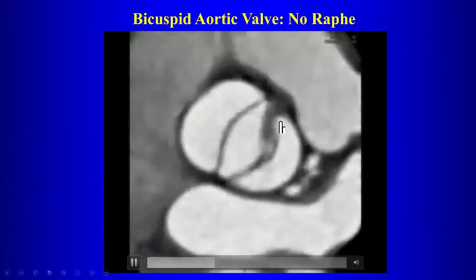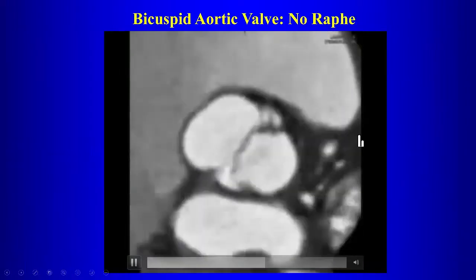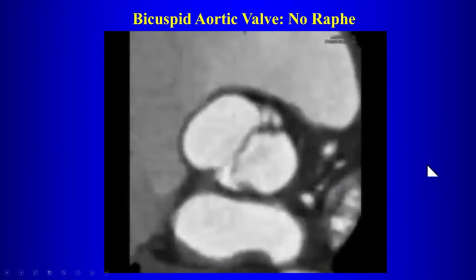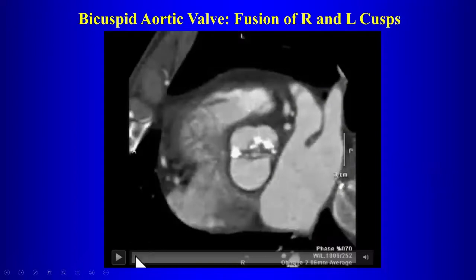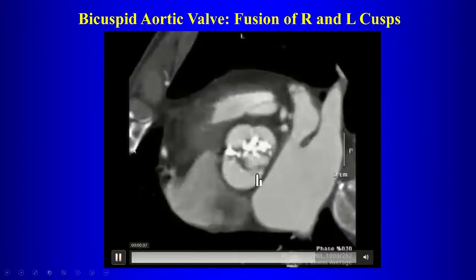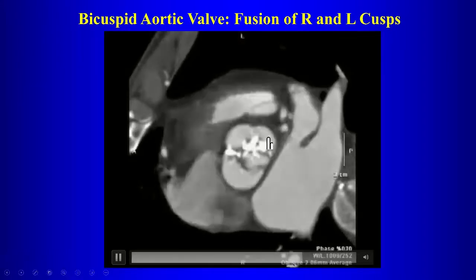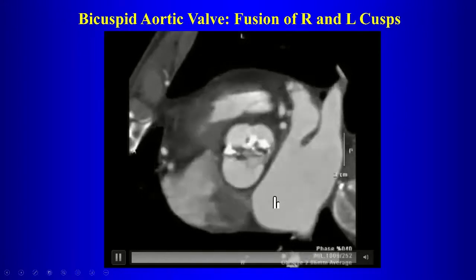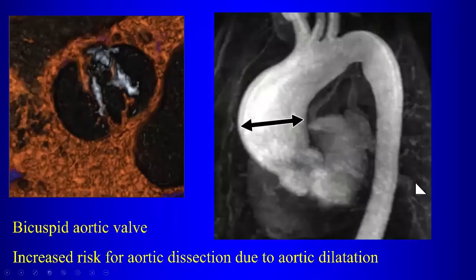So here's a cardiac gated CT showing you a pure bicuspid aortic valve. That morphology is actually quite unusual to see. And then this one here, we have fusion of the right and left cusps. Over there, here's the left atrium, right atrium. Here's the posterior cusp, and that's the right and left cusp there that are fused, heavily calcified. Another example of aortic stenosis there on CT.